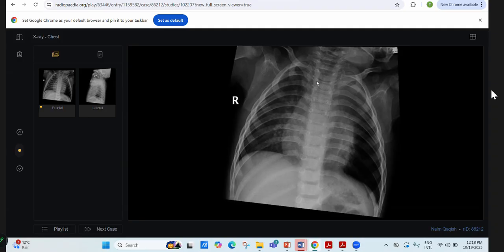because in the real exam, you should ask for decubitus views and explain how you will interpret them. In foreign body aspiration, in this case on the left side, whether the left side is dependent or the upper side, both ways it will remain hyperlucent, so the examiner knows that you know what to look for in decubitus views. Do you understand my point? If you are asking for any other view, then you should know how to explain that view.